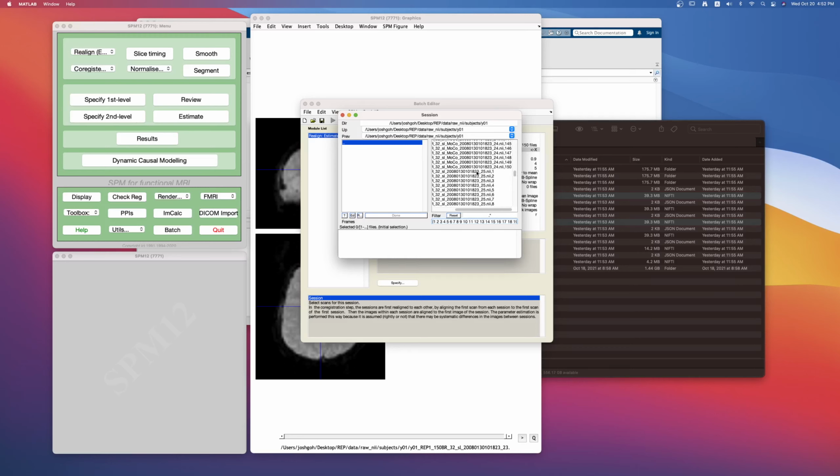What you want to do is click on the first volume of the series 25, and it will disappear and highlight volume 2. But you don't want to click on anything else, you just want to scroll down to 150, and again hold shift and then click the 150th volume, and it will have selected 150 files for series 25, volume 1 to 150, and then you're done.